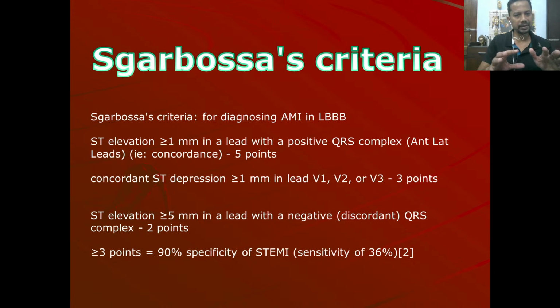Now there is an LBBB. Okay, there is ST depression in LBBB, but then depression has gone into elevation. So even 1 millimeter of elevation means from ST depression of maybe 5 small squares to 1 positive. So it is 6 small squares ST elevation.